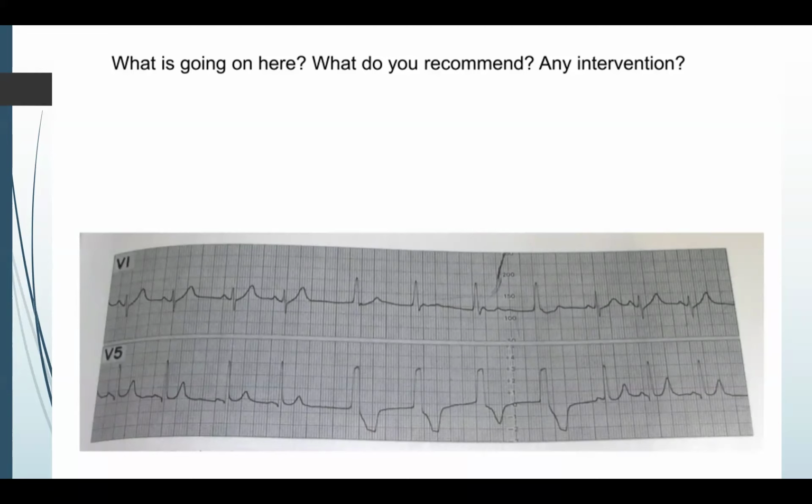So I think it started as sinus, and then the wide QRS, I assume, are PVCs. So they're seeing 4 beats. I would call them non-sustained VT. Okay, well, is that VT? How fast or slow are those beats? It's almost as fast as his base rate, so it's like 70. So it's not VT.